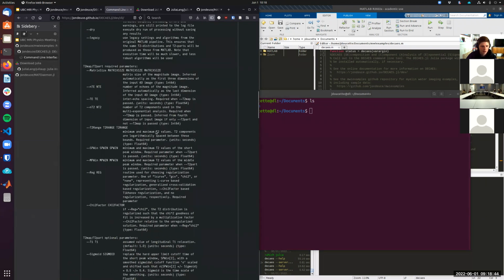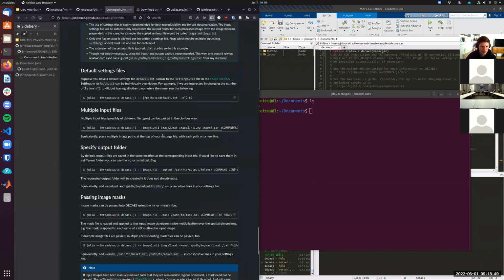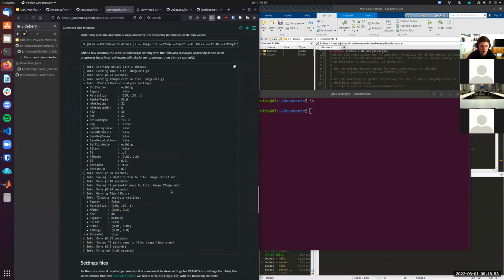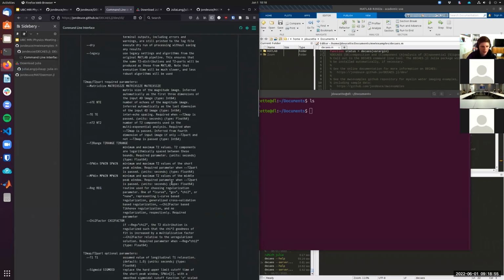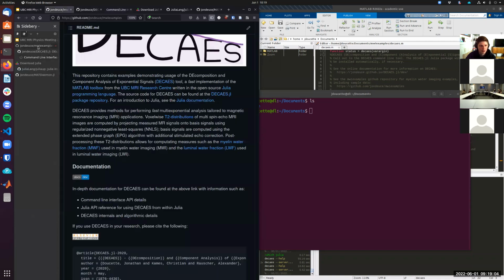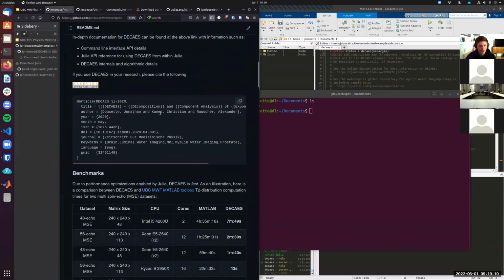There is lots of documentation about each parameter, and I encourage you, if you have trouble finding something or something doesn't work, to check here first, because there is probably the answer you need in here. Otherwise, of course, I'm always open for emails and this sort of thing. We'll probably come back here later to look at some details of the settings for reference, but for now, we'll come back to this.